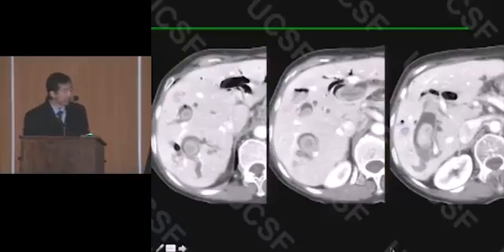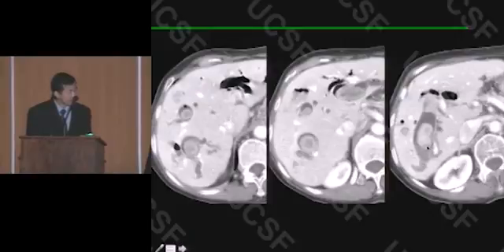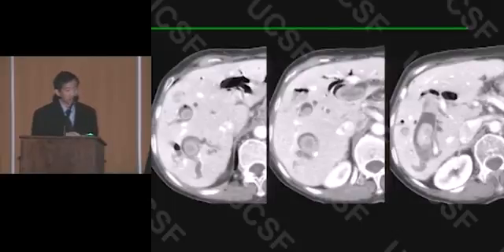Here's an example of another duct disease. These are big ducts. So what do we think about when we have large duct disease? These are dilated ducts, but they have these kind of odd filling defects. They're lamellated. They seem to be sitting in a dependent portion of the duct with crescents of bile anterior to them. There may be some pneumobilia anterior to these filling defects. These are stones. And we see multiple stones in dilated intrahepatic ducts with maybe very peripheral bile duct sparing.